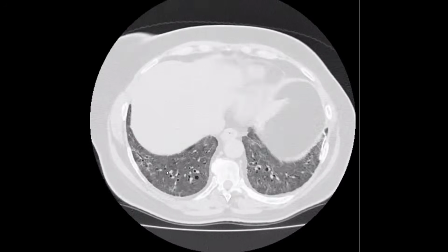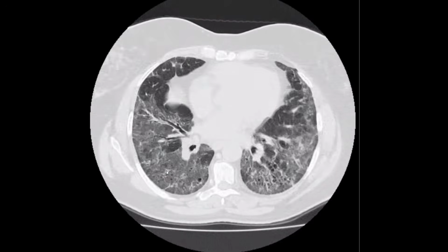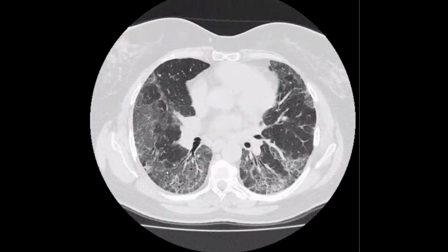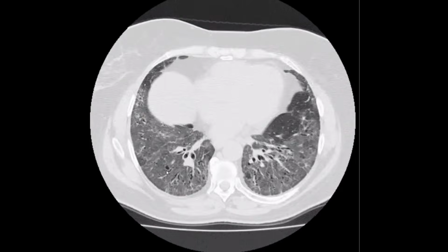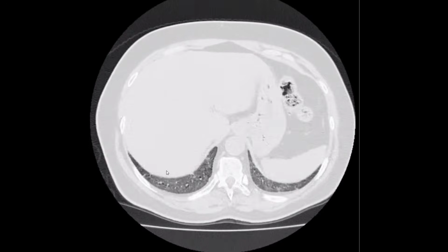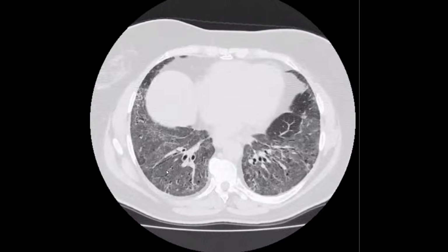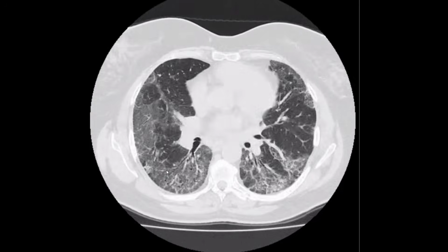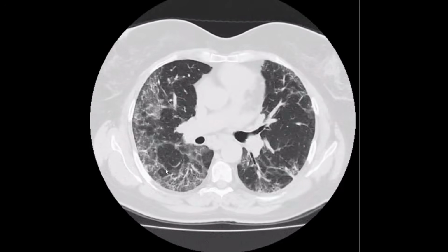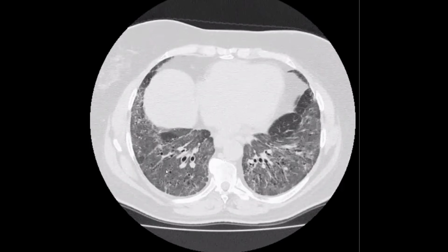Could it be bronchiolitis due to infection? Do you have any cystic honeycombing? Cystic honeycombing in the peripheral location is less likely. Less likely, yeah, you are right. Okay, it's not so obvious. Okay. Esophagus is also normal. There is no dilatation of the distal esophagus seen. Okay. No pleural plaques are noted.